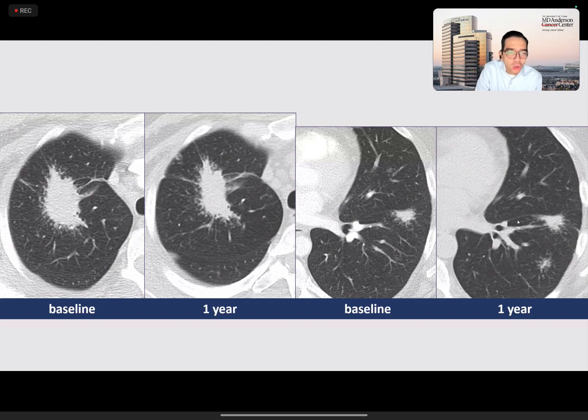And how do I know that this is sarcoid? Well, the way I can tell is that if you look at the periphery of these lesions here, you can see that it's made up of tiny, tiny little nodules. Whereas a consolidation is typically, it might fade off into ground glass opacity. But in this case, you could see that the periphery are many tiny nodules, and the mass, therefore, is a conglomeration of multiple small nodules.